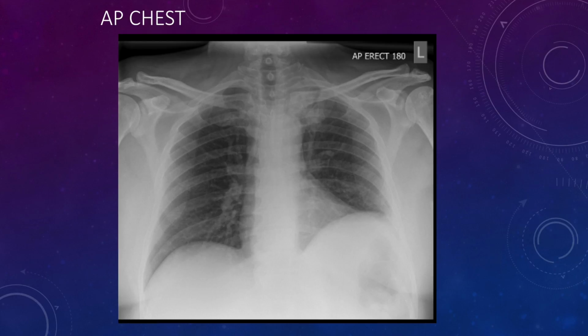Okay, we have review areas on a chest x-ray, and the main review areas that we need to look at are behind the heart, because the lung fields are obscured behind the heart, and the heart can mask pathology that's sat there in the back of the lung behind the heart, and the lung apices. They are our review areas. The apices are very busy. You've got the first rib, second rib curling round. You've got the clavicle coming across. You might have a bit of apical pleural thickening. You've got the trachea that may or may not be central, depending on if there's any other pathology. Anything concerning you?